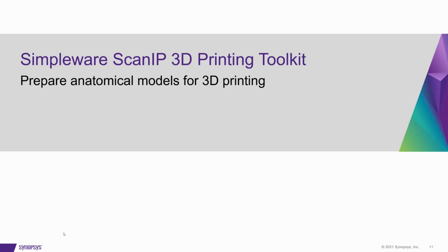And the 3D printing toolkit is a new addition in our June release last month. So it's relatively new, but it's all been built towards this FDA clearance and enabling you to go from DICOM to 3D print, so the end-to-end solution, all within one package. So you don't have to export an STL, do all your fixing, editing, and prep in a CAD software or other software outside of your segmentation software. So we're really streamlining the workflow with this new addition.